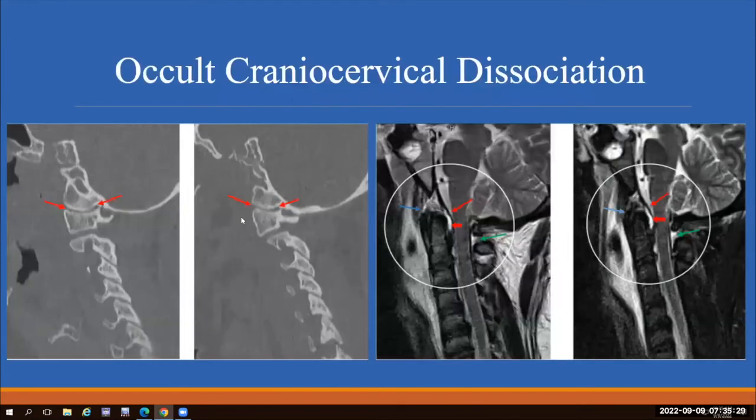A lot of neurosurgeons, from my experience, are going to look at a CT like this and say, well, this isn't a craniocervical injury, because this is the occipital condyle, this is the lateral mass of C1, and that's a normal joint space, 2 millimeters or less. And then this is the other side, and you could argue there's a little bit of asymmetry, but if you call this on people, you'd be wrong most of the time. They look at this side and say, all right, that side's normal too. So, next patient, we don't need to do anything for this patient.